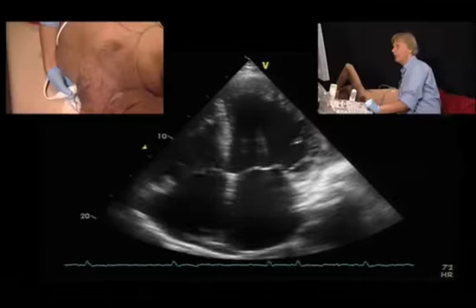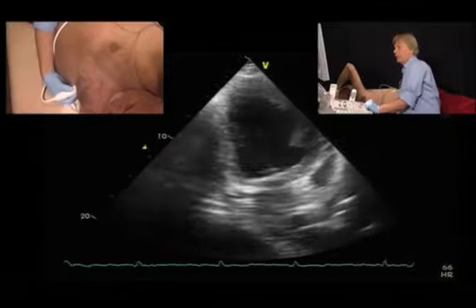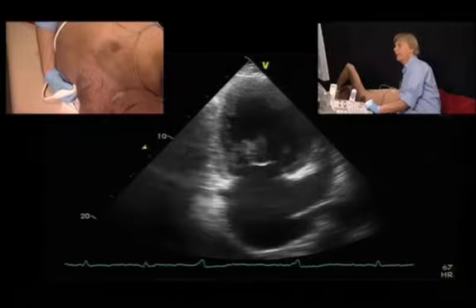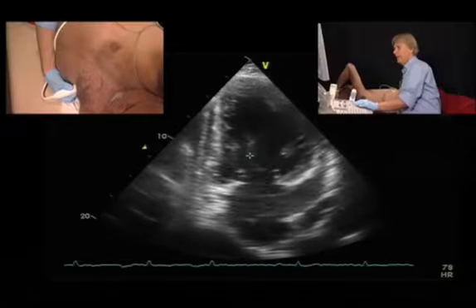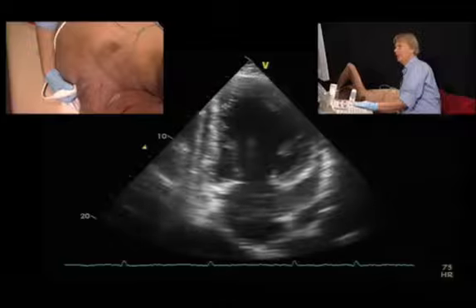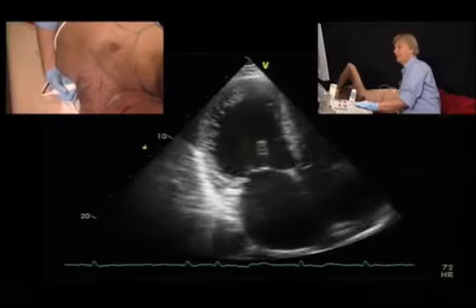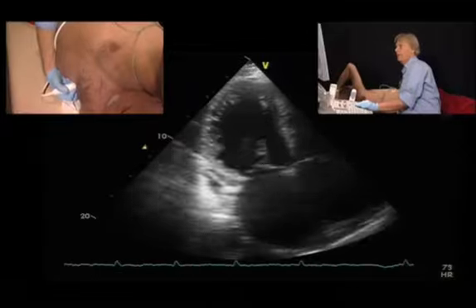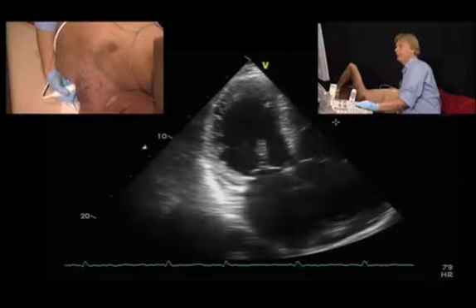Again, look at the motion of the mitral valve. You can see that it doesn't open completely. And if we look at the regional wall motions, again, we see that there are regional differences. Even though the patient for sure has dilated cardiomyopathy, he has a normal angiogram, and we see a wall motion abnormality here. This part of the inferior wall is actually akinetic, and also the posterior lateral wall seems to be less contractile than the remaining portions. Also take a look at these trabeculations here. Maybe there is some rudimentary form of hypertrabeculation here.